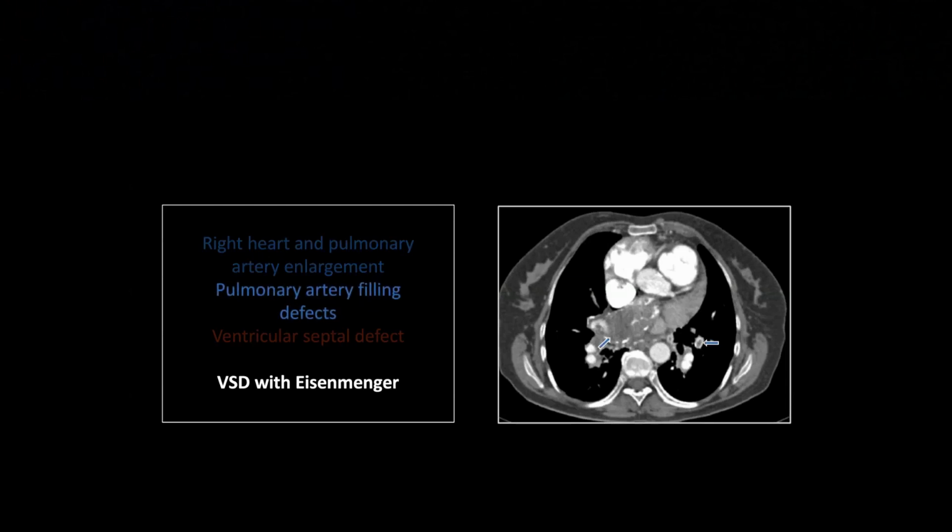All right, so we go a little lower, and there actually are pulmonary emboli. The one in the left lower lobe is the one I call your attention to.